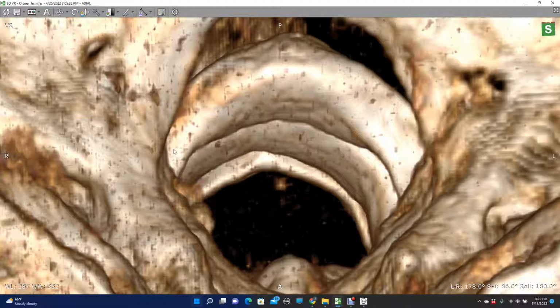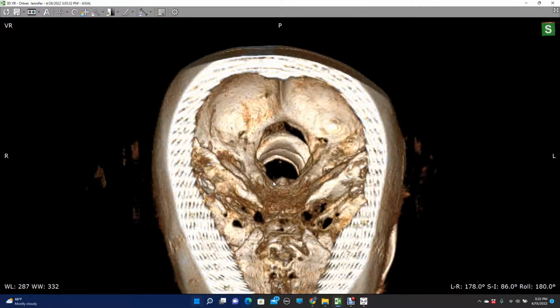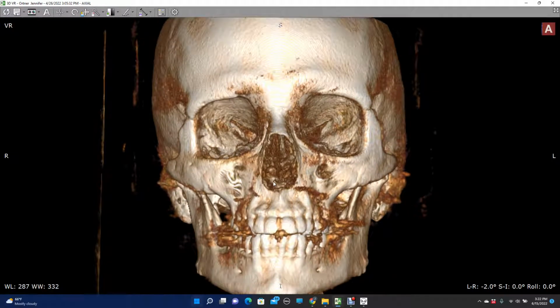So we're actually going to think that this atlas looks like it's more of a right lateral since it's tucked under here. And I don't use this firmly, but it is one way to think about your measurement. So let's bring it back down till we're at a 0 degree rotation. As the I is back at 0, we're at -2. There's no rotation in the skull.